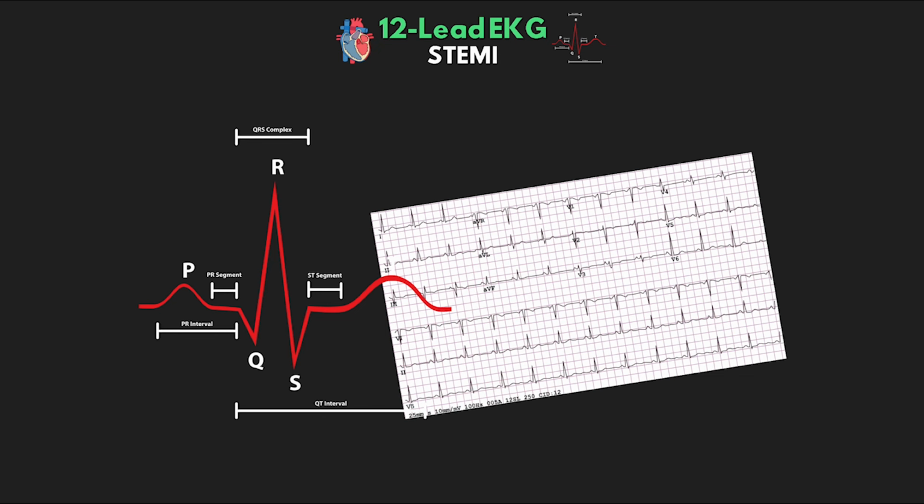Alright, so far we have worked through a ton of lessons in this 12-lead EKG series, and I know this lesson is the big one that most have been waiting for. In this lesson, we're finally going to be talking about the big one, ST elevation, and particularly STEMI on our 12-lead EKG. We have a lot to cover, so let's get started.